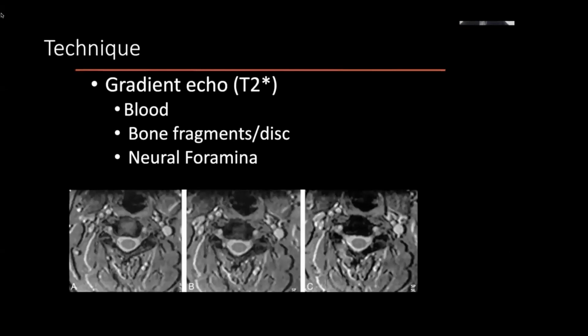And that is a T2 sequence which has been adjusted in a certain way to either remove fat or to remove the physiologic water. So the only bright signal you're seeing is from pathologic edema, as opposed to water from, say, CSF. But really just telling you what the basic fundamentals of these sequences are that you will see in everyday practice.